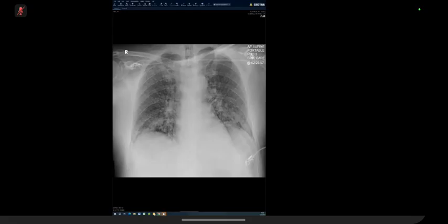Okay. What else can it be? You describe them as nodules. Let's stick with that thought, that they are bilateral nodules. It could be miliary nodules, as in metastasis or due to infectious cause. Or fungal infections also could be.